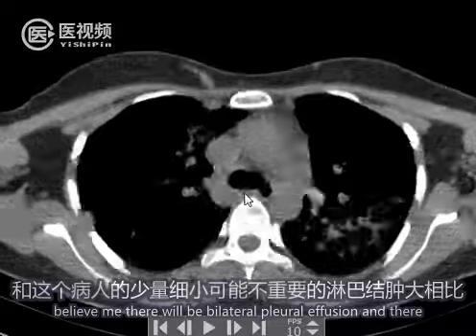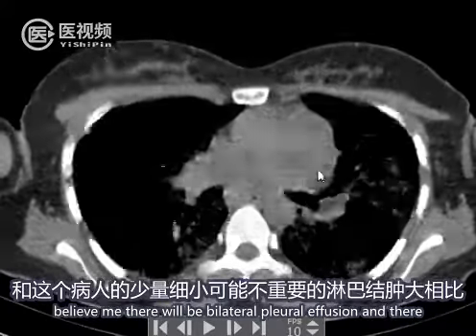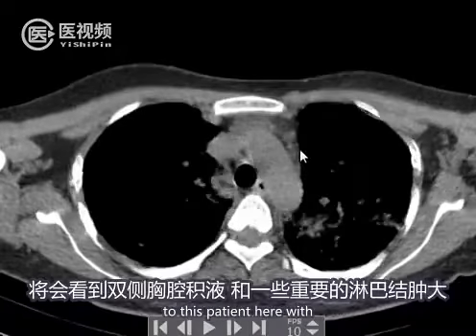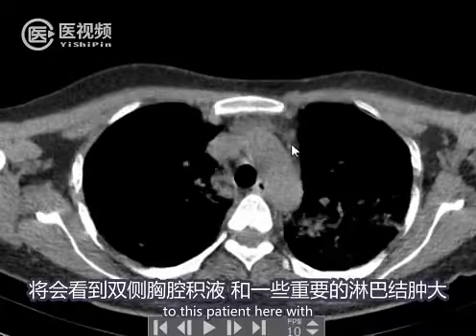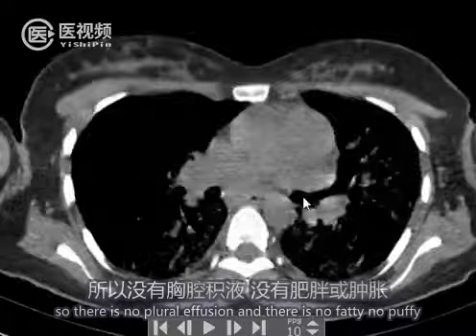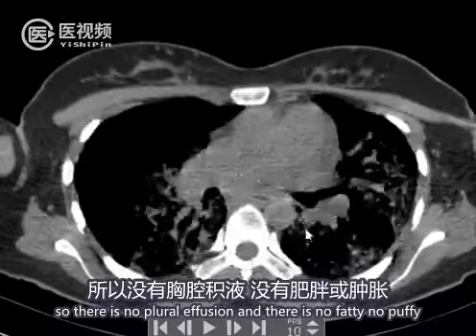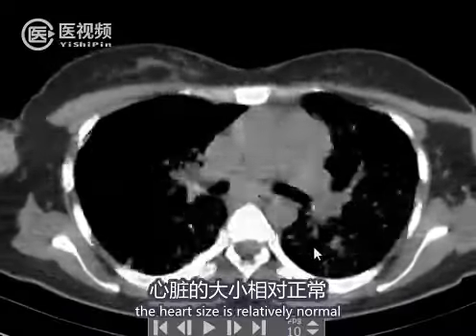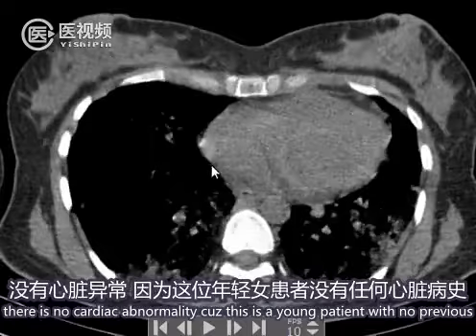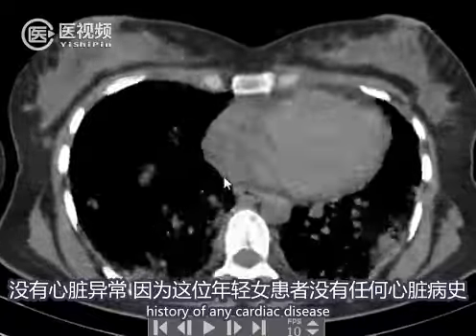If this was a bacterial infection, believe me, there would be bilateral pleural effusion, and there would be some significant lymphadenopathy, as compared to this patient here with just a few tiny, probably insignificant lymph nodes. So there is no pleural effusion and no lymphadenopathy. The heart size is relatively normal. There is no cardiac abnormality. Consider this is a young patient with no previous history of any cardiac disease.